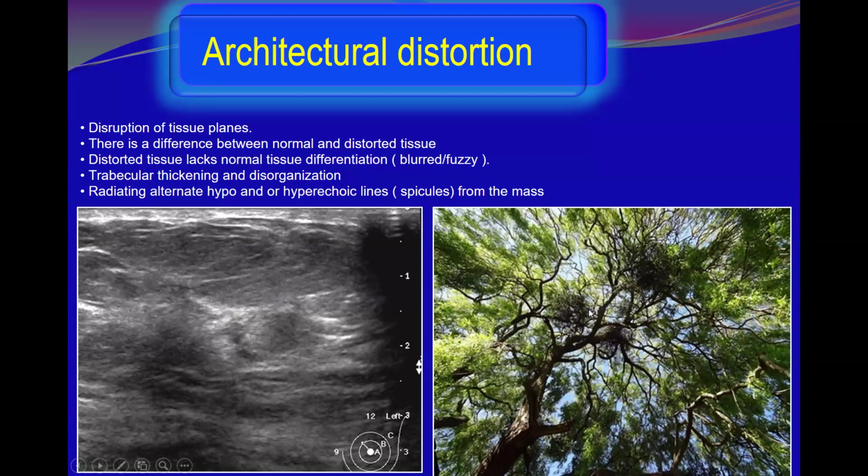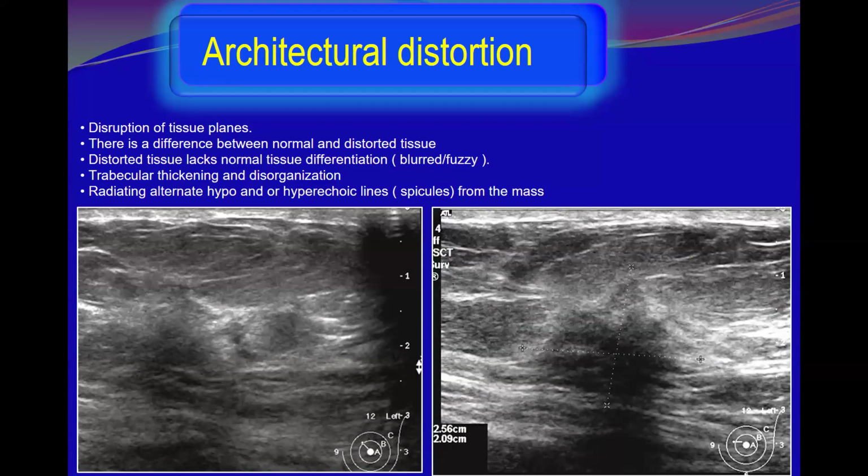But these areas definitely look different from normal, are black and clumpy. So this is the same, this area is blacker than the normal parenchyma and clumpy, not a mass, but an area deviated from the normal.